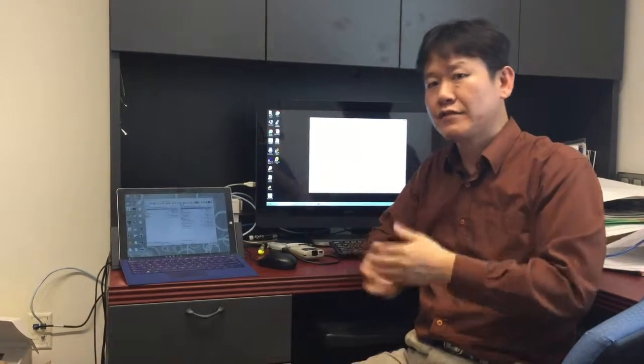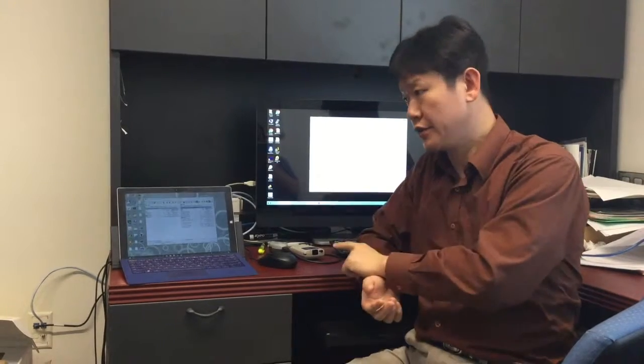Hi, so I'm going to show you new programs. Now the old name was Mappy, now the new name is called mapdeck. Before, we had Mappy and wavedeck separately. Now this mapdeck program has map and wavedeck as well, and you'll see it on the screen here.